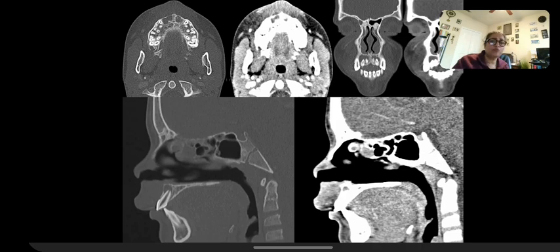And you can see a small, let me see if I put arrows there, small abscess over here. I don't have a mouse on this, but let me see if I can use this. Can you see? Okay. So you can see that there's a very small abscess there adjacent to that yellow arrow, and you can see a lot of swelling involving the upper lip. So this is how you want to pay attention to that. That small abscess is the red arrow.